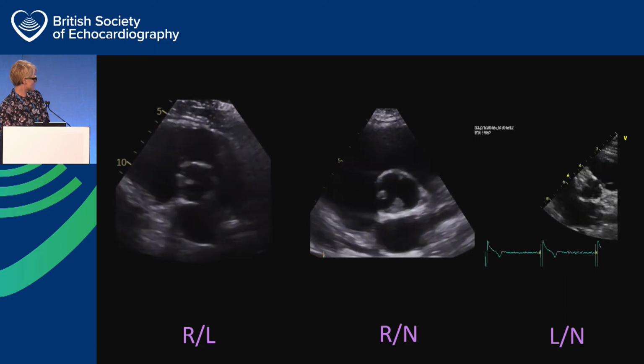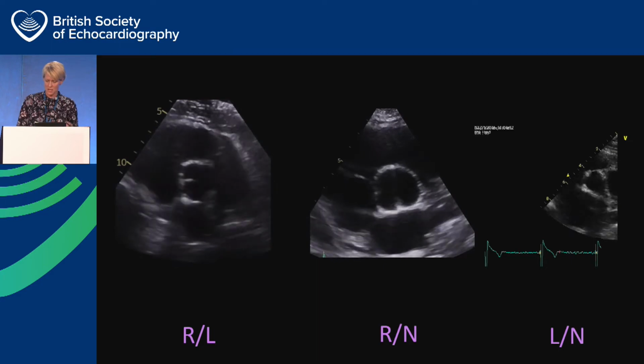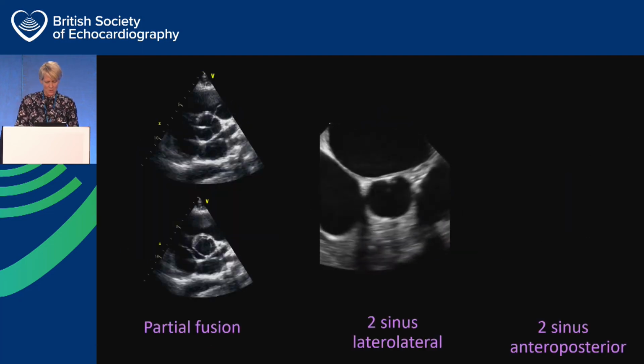And then this is actually a child. This is vanishingly rare. I've only ever seen a couple of adults with this, and I can't remember their names, so I couldn't get their pictures for this meeting, but that's one that I stole from someone else. So these are the other types.